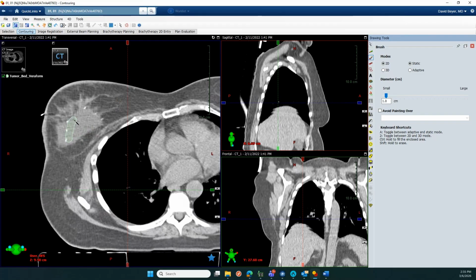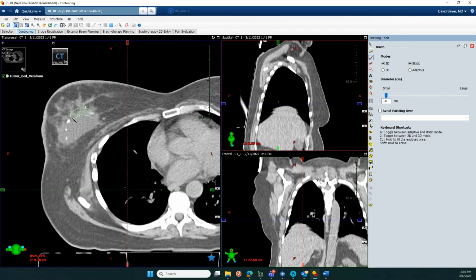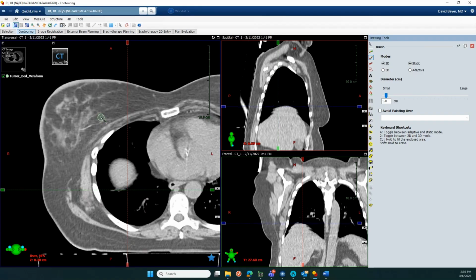So now I don't see anything here posteriorly, but I know from the level above and below that there was something there. So I'm going to cross that over there, bring it all the way down. I've got some VeraForm that is here, a little bit that comes over here, and close that as one contiguous volume.